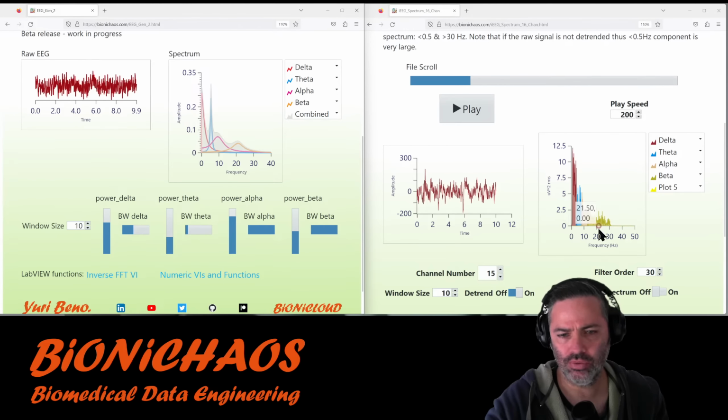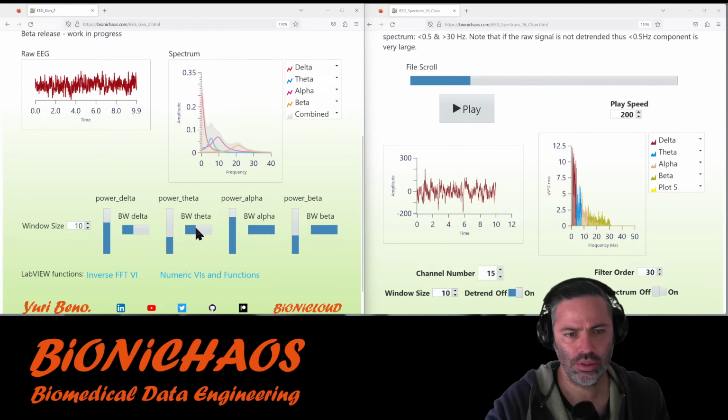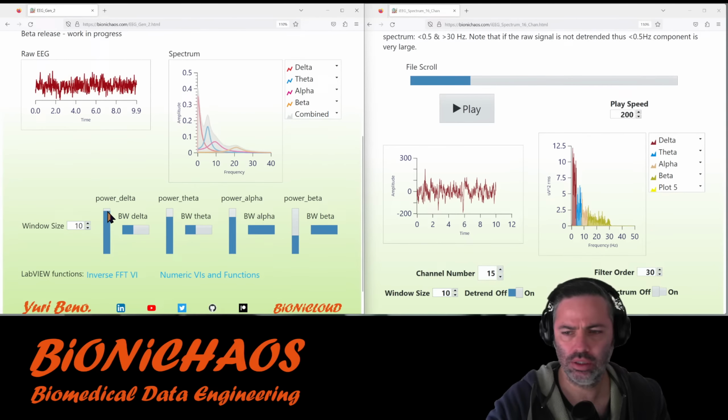If you look at the overall shape, they just look like a continuous shape. So maybe we can do this. Then we have theta increase. Yeah, there's a bit of a jump there in theta, and then delta is much higher.